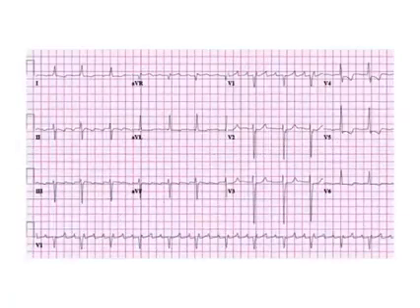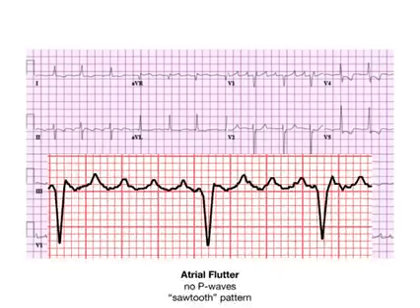This is our next example. What is this? Pause the video if you need more time, but I'm going to give you the answer. This is atrial flutter, and atrial flutter also has no P waves, just like AFib, but the big difference between atrial flutter and atrial fibrillation is what's classically referred to as the sawtooth pattern, and I've superimposed it on the slide for you to really be dramatic about what it looks like. But on USMLE or Comlex, they have to give this to you. They can't give you an A flutter question without the sawtooth appearance because you just frankly won't be able to answer the question. So if you see that really choppy sawtooth pattern, it's A flutter. Stop what you're doing, pick it, and move on.